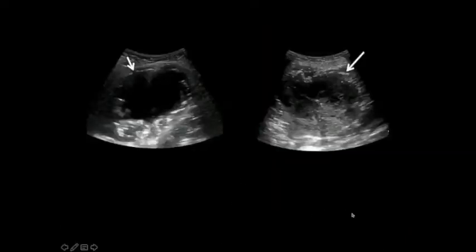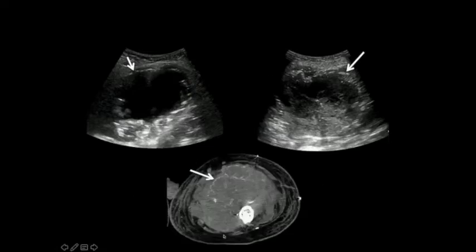Again, just want to emphasize the importance of looking at the characteristics of what you're seeing on your ultrasound to just try to get more information. So in this case, we're looking at two images where this area is predominantly fluid. You may think, is this an abscess, is this a hematoma, or some other process? But if you look very carefully where I have the arrows, there's this thin curvilinear areas of echogenicity. These are consistent with calcifications, and if you look at this non-contrast CT, you can see the same calcifications.